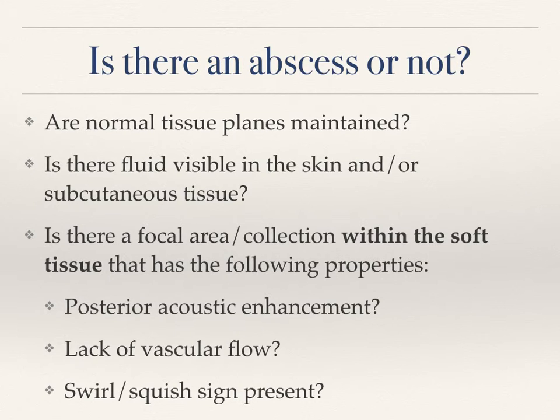And then if there is a focal collection within the soft tissue, that most likely will have irregular borders. Does it have posterior acoustic enhancement, lack of vascular flow, and a swirl or squish sign? Not every abscess that we see will have read the textbooks to have all of these signs. But again, you'll have this discussion with the patient, maybe their family members, maybe a surgical team, likely a consultative ultrasound potentially as well, and you'll go from there to make an informed decision.